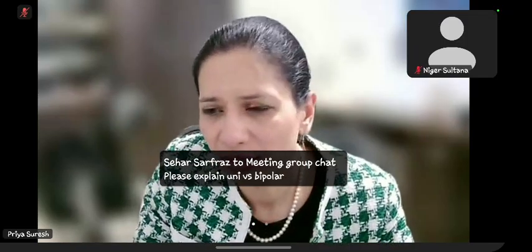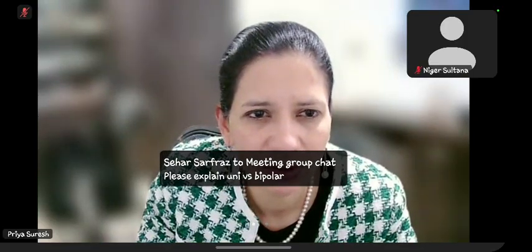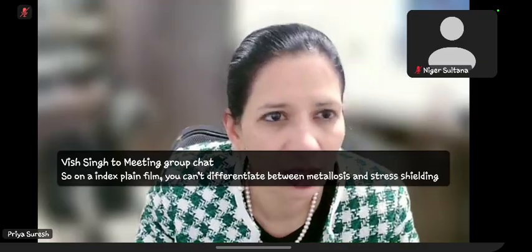Cement versus non-cement. So I think we have seen this one. Let me go back. Cemented versus non-cemented. You wanted to see that again, so let me show this. And you said to use the pointer also, so I'll try and do that.